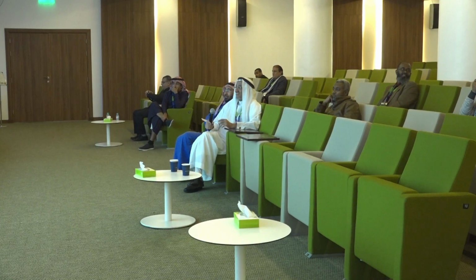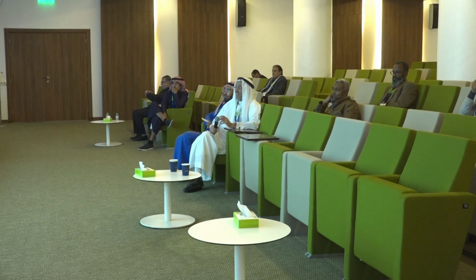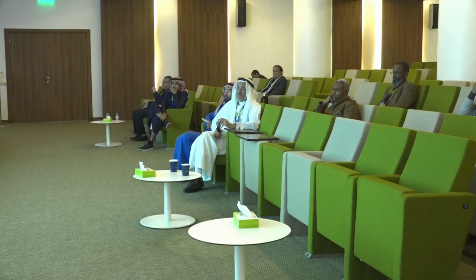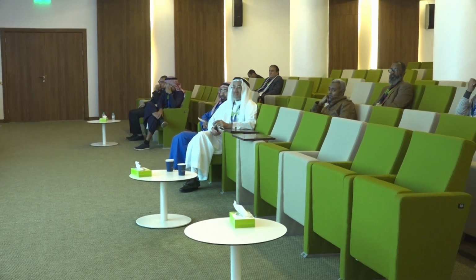So, to answer the title of my lecture, point of care ultrasound, is it worthy? Yes, focus nowadays is considered an essential complement to physical examination.